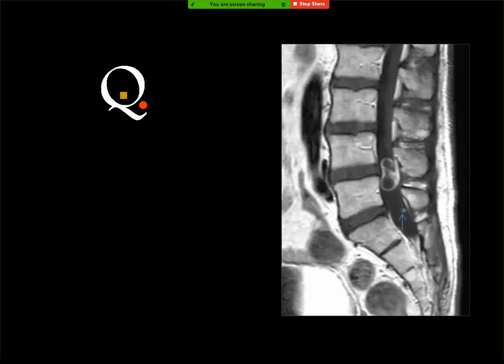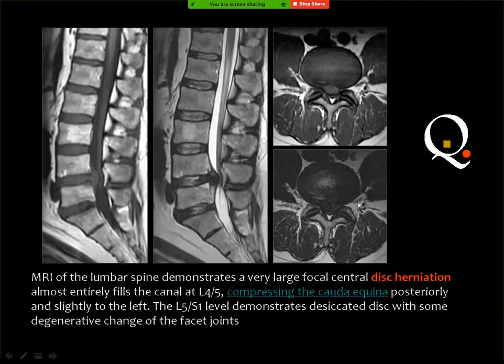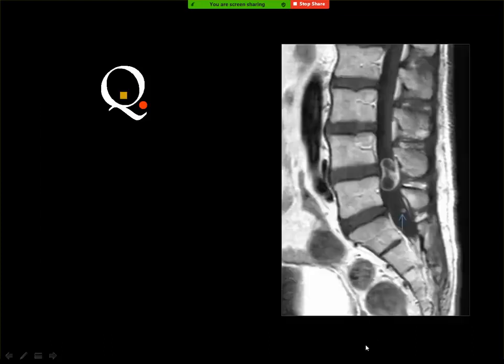Doctor, excuse me, the case before had a hemangioma. Where? In the vertebral body. This hemangioma. Yes. And the hemangioma is an incidental finding, and you may mention it, of course, in the exam.